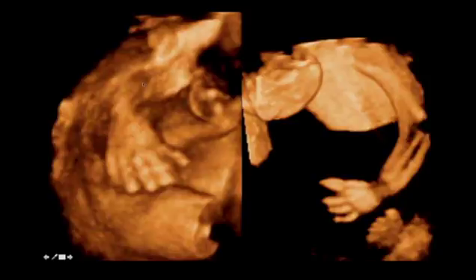And if you look at the hands of this fetus, and this is one hand, this is the other hand, you'll see that all the fingers are in the same plane. So this fetus won't be able to oppose, won't be able to pick anything up with its thumb because all of its fingers are in a row. And the treatment here is to make one of the fingers a thumb so that it can actually grasp something. And this one here has a fused first and second digit on that hand.